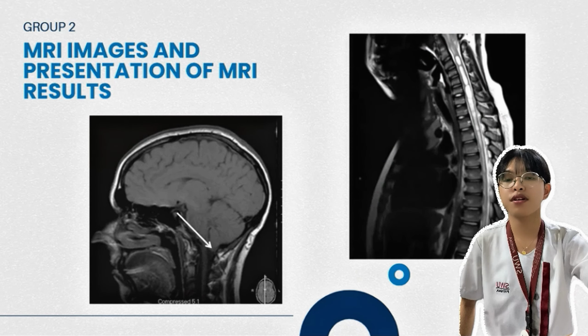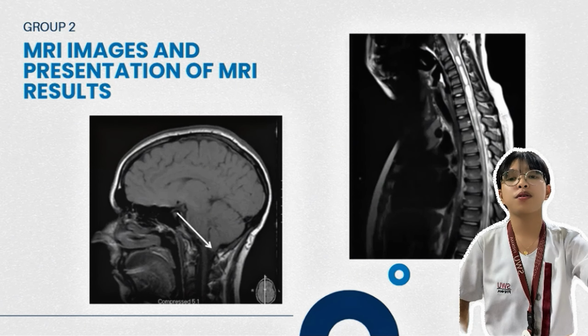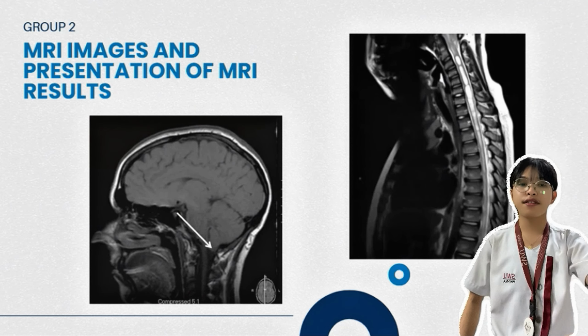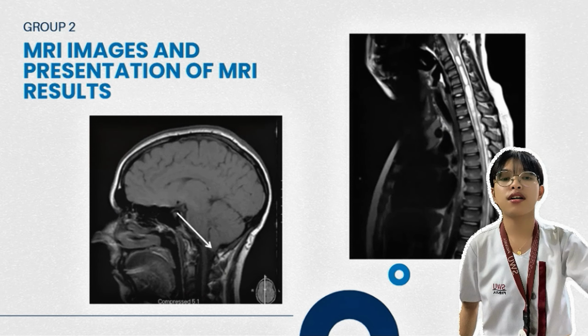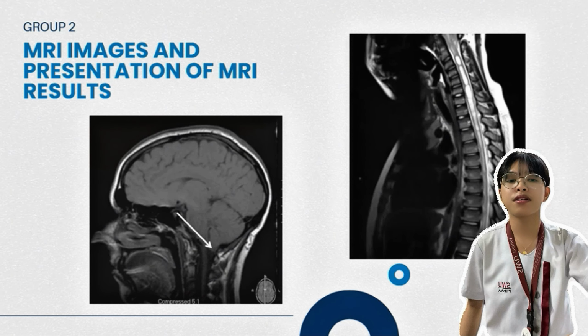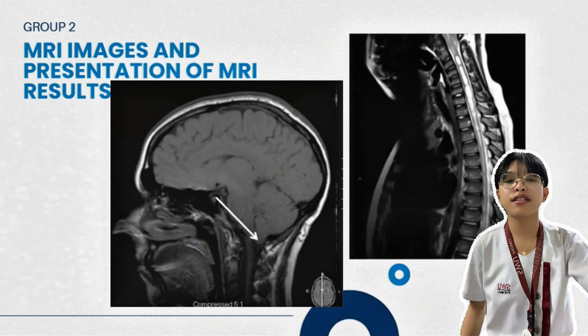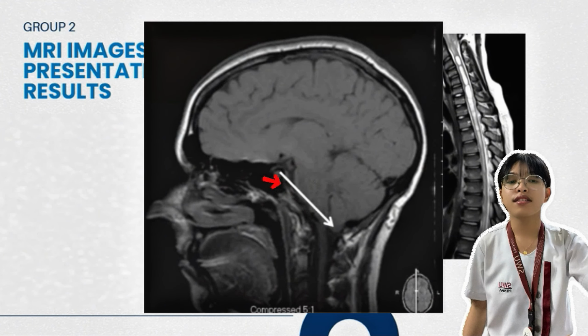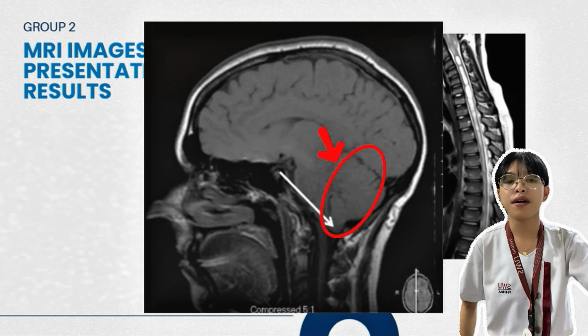So this was her scan. So you see a couple of very characteristic findings here. Hopefully you can see my cursor. But on a sagittal T2 of the cervical spine, you have the pons and medulla, and then you have the cerebellum back here.